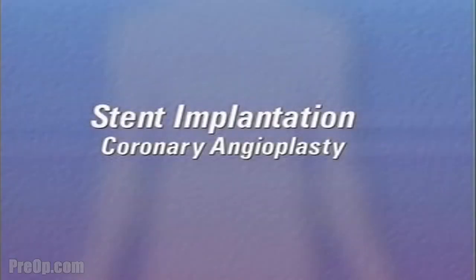Your doctor has recommended that you undergo a balloon angioplasty with a stent implant. But what does that actually mean?